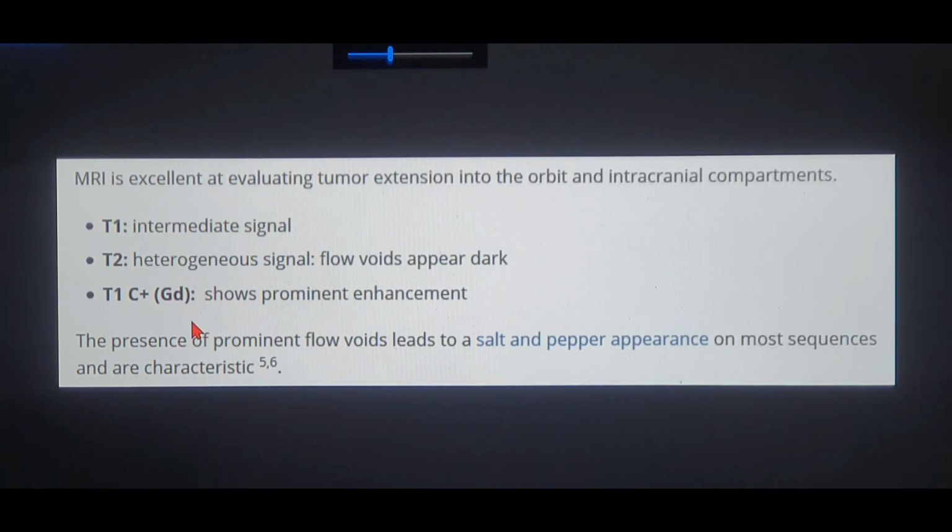enhancement. But in cases of invasive fungal sinusitis, where the most common example is mucormycosis, the mucormycosis will cause plugging in the vasculature once it invades. So that will block the blood supply, and the gadolinium cannot enter those blood vessels. So that will cut off, and the post contrast MRI scans will not show any enhancement, suggestive of necrosis taking place. So that is also how you can study the MRI scans in different conditions.